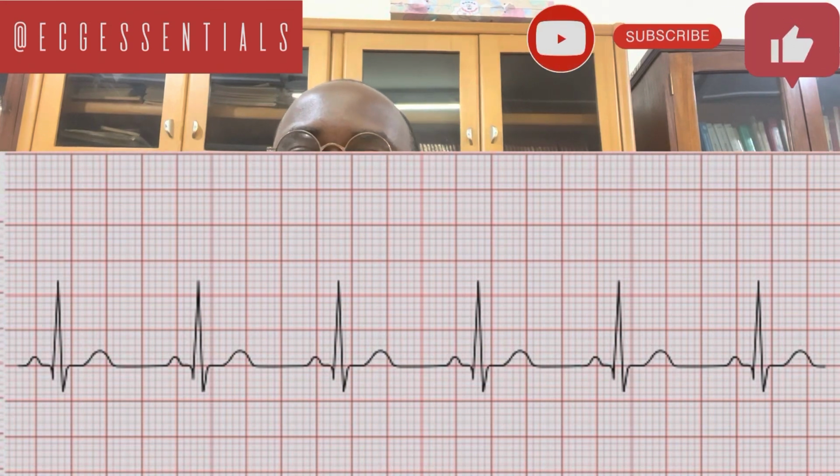So when we are reading an ECG and we see such information, then outrightly we know that this is a sinus rhythm. However, if P waves were to appear abnormal, whether notched, inverted, peaked, any abnormality, and then we find that the rate or the rhythm is irregular, then it may give us an idea that, of course, this rhythm is not coming from the sinoatrial node, but perhaps it's originating from the atria themselves, or it's a junctional rhythm.